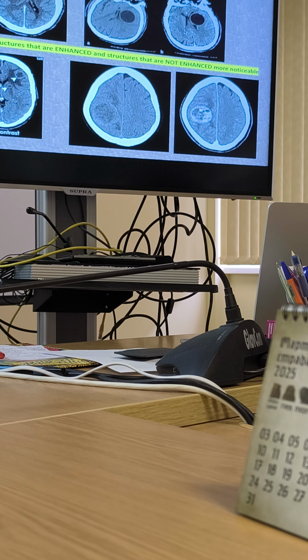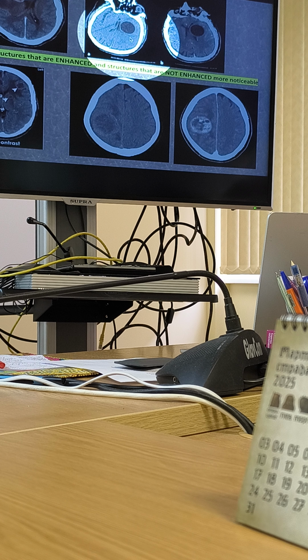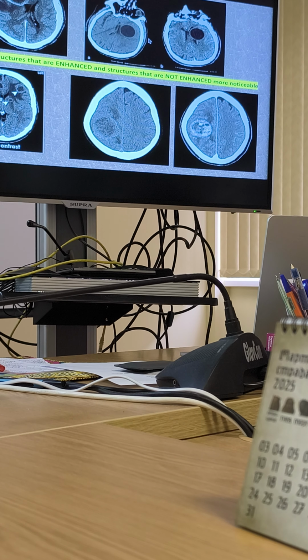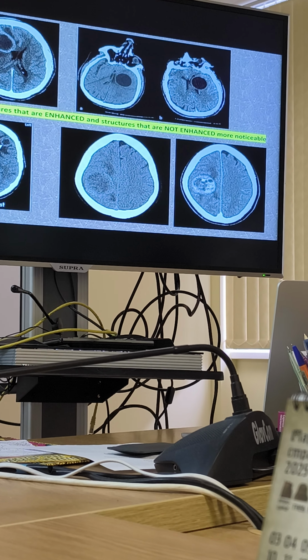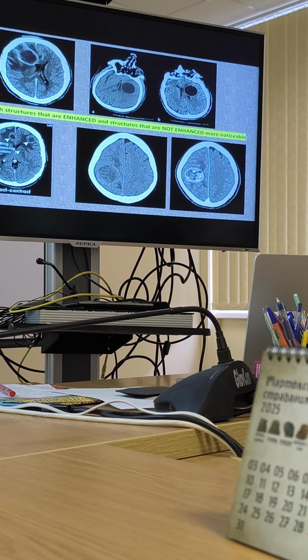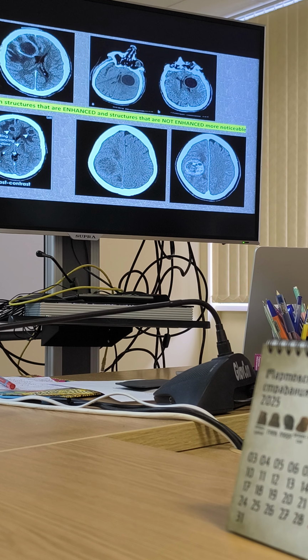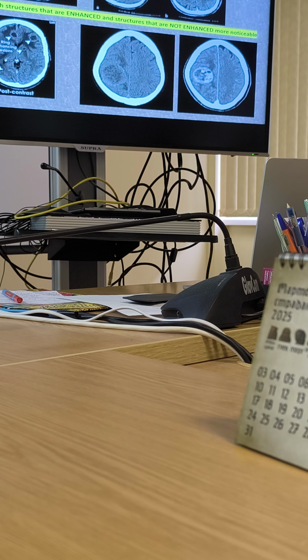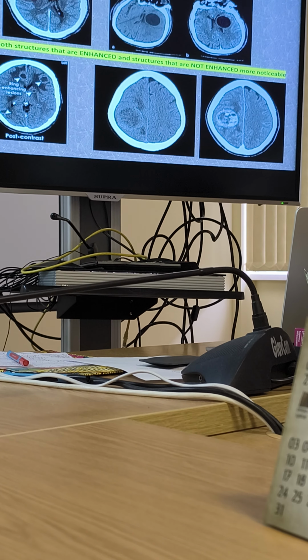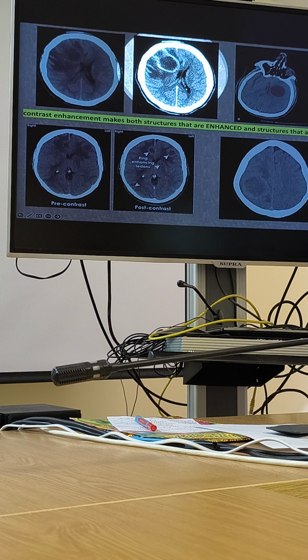And another thing that could be helpful, yeah, if you compare this brain and that brain, could you see this effect of turning the light on, that they are more different in color? Yeah, and what does that mean? That means we can see white matter and gray matter in different shades because gray matter is tissue with more vessels, because these are neurocells, yeah, and white matter is fibers, and there are fewer vessels, and so that's why we can see the difference between white and gray matter in bigger detail. In recognizing the lesion, can you see it more clearly?